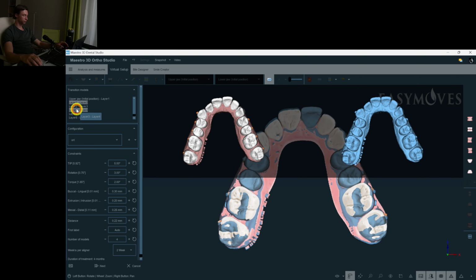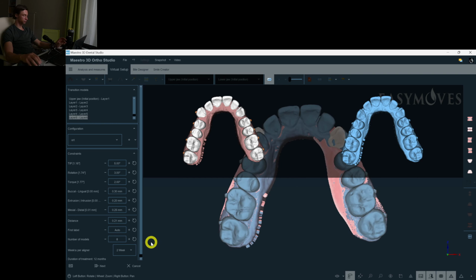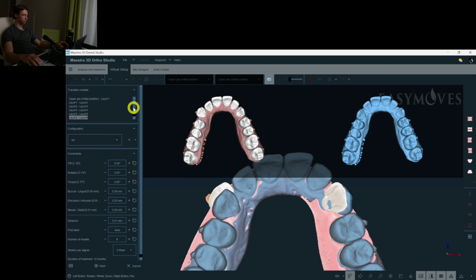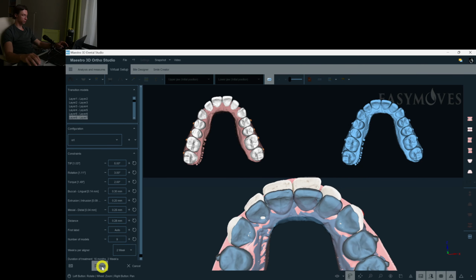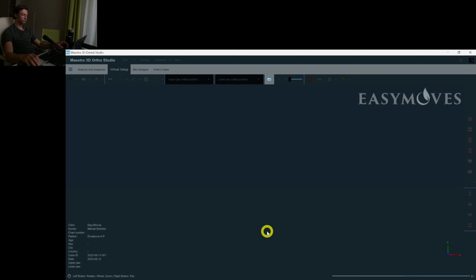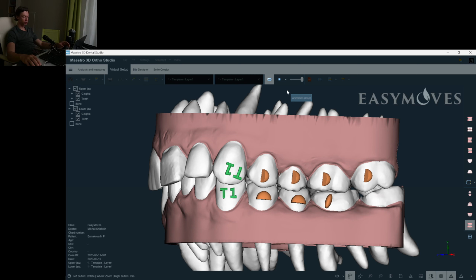Four, four. Let me be 8. And 10. Oh, 9. I don't know why, but Maestro constantly crashes when I launch the animation.